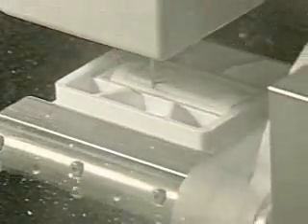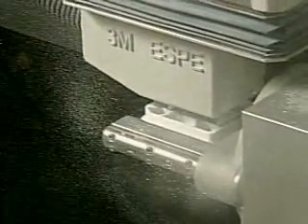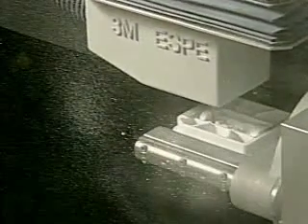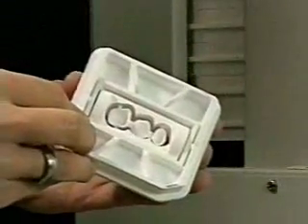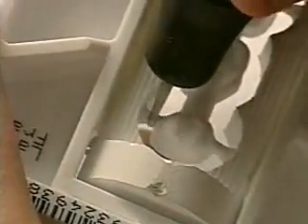The shrinkage occurring when the bridge is sintered through was considered when the cutting paths were calculated. As a result, a very good fitting precision was achieved. The marginal gap is 50 microns on average. Single crowns are ready after 35 minutes on average, with three-part bridges finished after 75 minutes. The connection bars are removed and the anchor points and possible sharp edges rounded with rubber polishes.